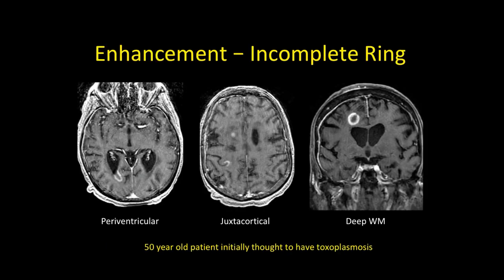And again, one of the characteristic hallmarks of demyelinating disease, if you see it, it's a home run, is incomplete peripheral ring or horseshoe-like shaped enhancement. This patient was initially thought to have toxoplasmosis at the outside facility. There's an enhancing lesion that we might see in MS that is patchy, flame-shaped, ovoid, could be a Dawson's finger type enhancement.